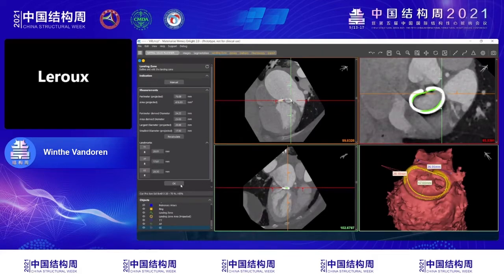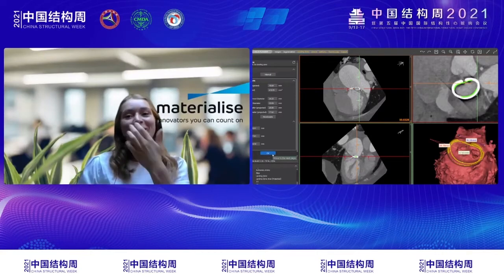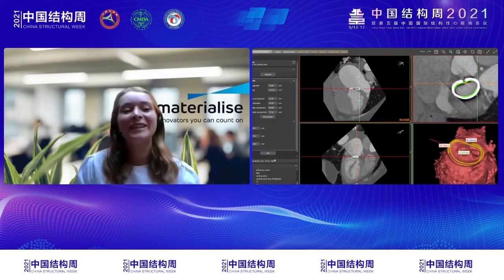No questions, but we have to say that it's very impressive to do all this manipulation in direct live, and it seems to be so easy to use. It seems easy to use. Yeah, it is actually very easy to use. That's my goal of showing you today.